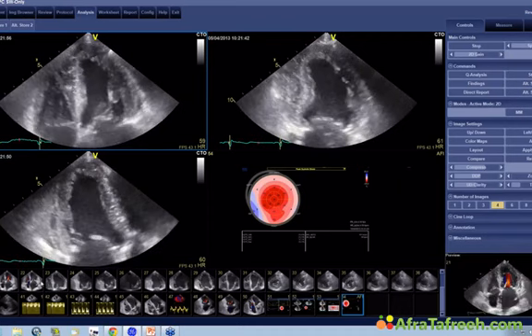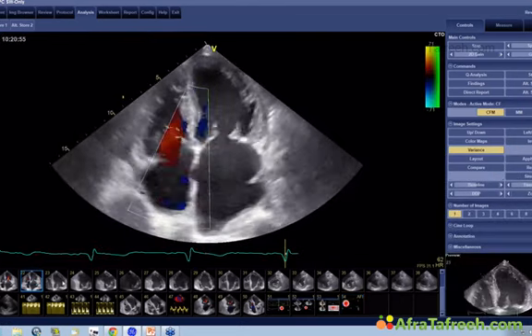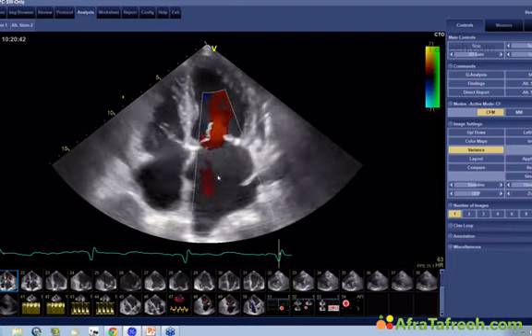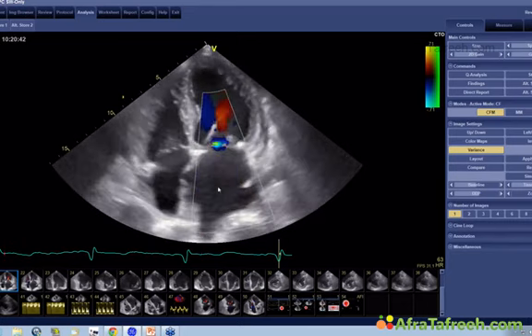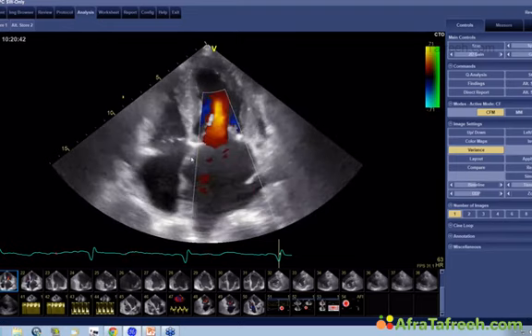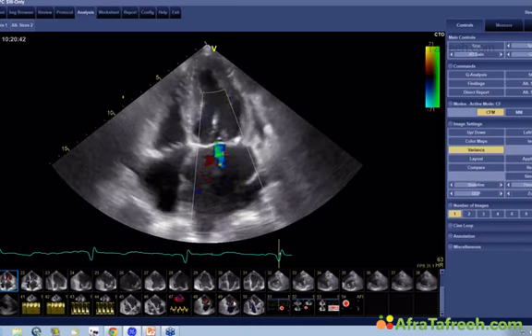Just to answer a question that was brought in, if there was an aneurysm of the interatrial septum, let me go back to this image here. Well, in a way, I would not call it really an aneurysm. This is the fossa ovalis here. And what happens is that the pressure in the left atrium is so high that it pushes the fossa ovalis towards the right. In our terminology, we call this LAP, which means left atrial pressure is elevated. A real aneurysm would probably be more exaggerated, bulging into the right atrium.